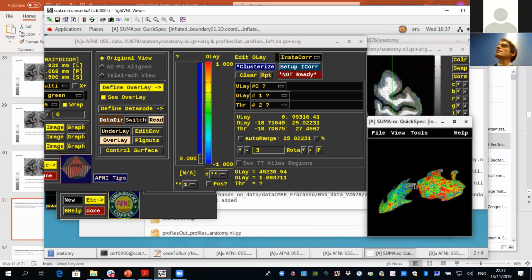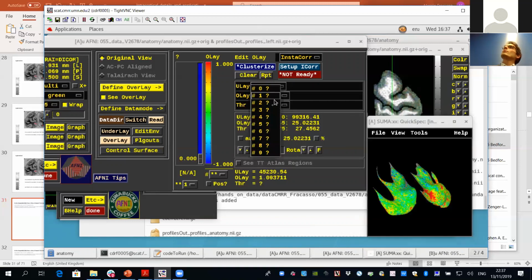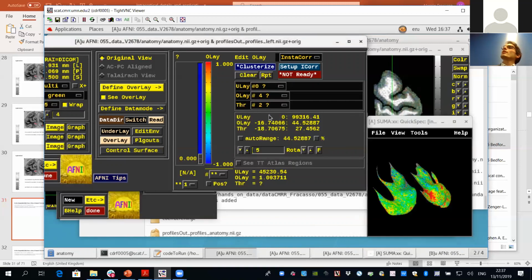And this is the bulk of our activity here, right? And if we move, this is cortical depth, essentially. So this is very close to the white matter border. Let me scale it a little bit more. There we go. This is very close to the white matter border. Then we can go more approximate around the middle.